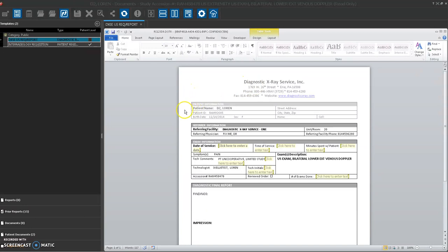And what you're doing for a regular ultrasound exam that's not being written into radiology, that's going to be a separate tutorial. So click on that one if you need to know how to do the interradiology requisition. So if you're just doing a regular exam that is going to get read in Ramsoft by the doctor, then this is what you're going to be working with right here. So over here to the left, we see that templates is currently open. Now if something else was already scanned in or anything like that, then it might be on another area here. So to create your document, your rec/report, just make sure you click on templates.